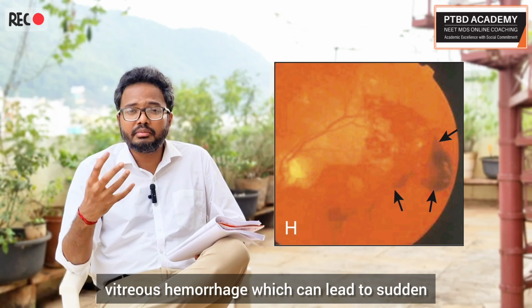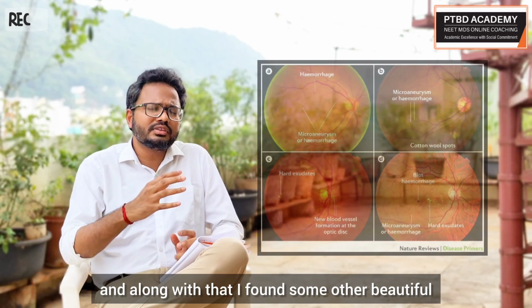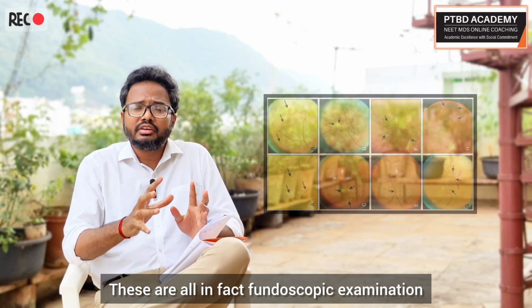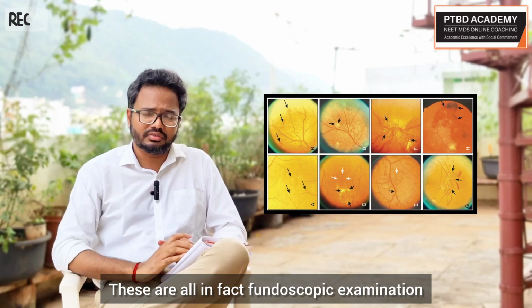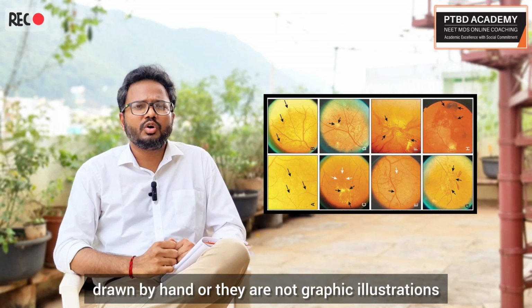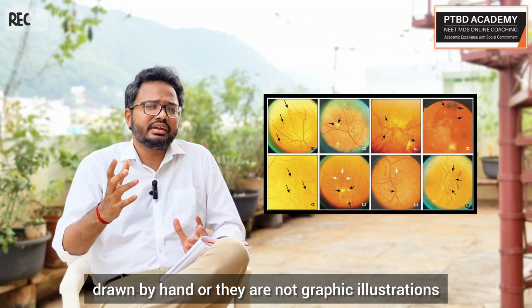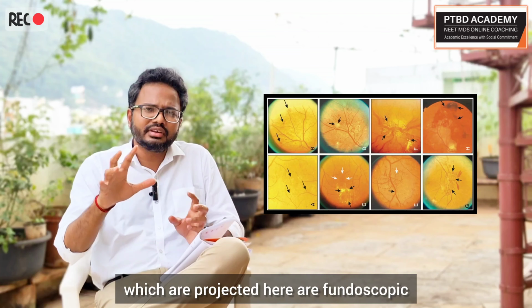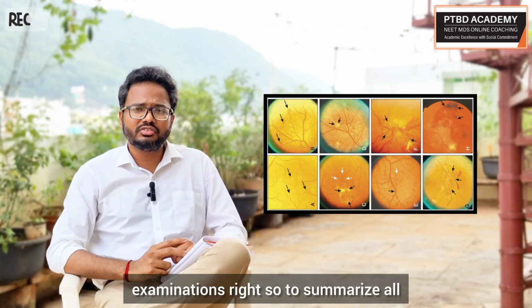So these are some of the images which I wanted to highlight. And along with that, I found some other beautiful illustrations and images. These are all, in fact, fundoscopic examination, right? They're not drawn by hand or they're not graphic illustrations, but they are actual fundoscopic views which you can notice in diabetic patients when you observe their retina. So all of the images which are projected here are fundoscopic examinations, right?